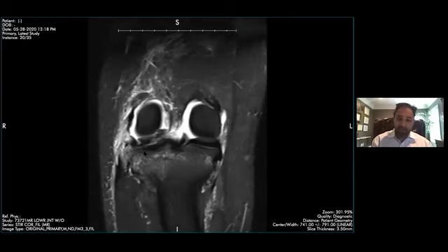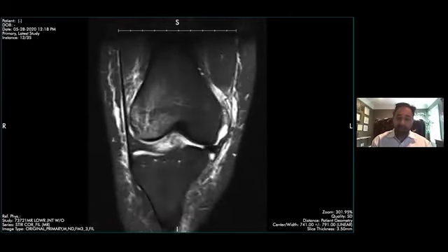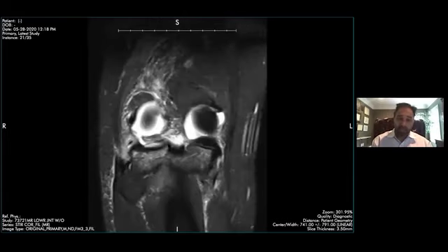Okay, so yeah, there's signal here, right? This meniscus is torn, right? There's a tear at the periphery of the lateral meniscus, right? The posterior horn of the lateral meniscus. This is, anteriorly, right, where the meniscus is attaching with a transverse ligament along the tibial root attachment.